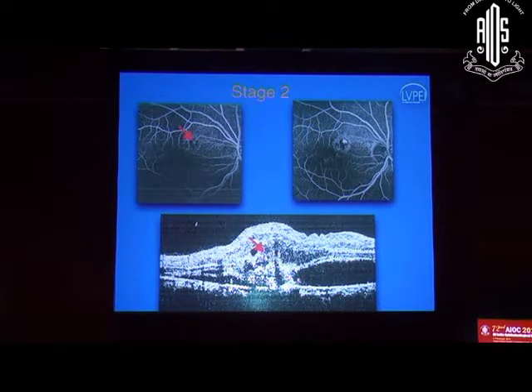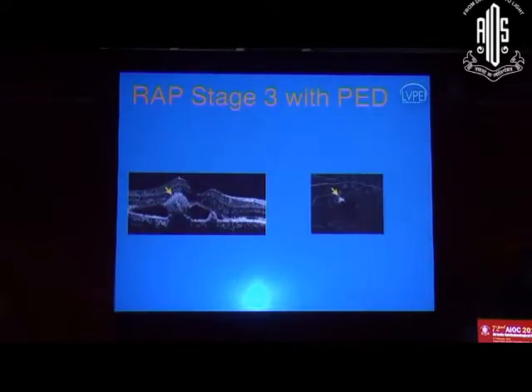You see a subretinal hyperreflective area, but along with that you see an intraretinal lesion, which is not usually seen in the case of CNVMs. Again, the same thing: you see intraretinal fluid, and an intraretinal hyperreflective lesion going into the sub-RPE space. This is a typical example of an OCT going through this hyperreflective spot. You see an intraretinal lesion going into the sub-RPE space. This is another area where it is going into the sub-RPE space.